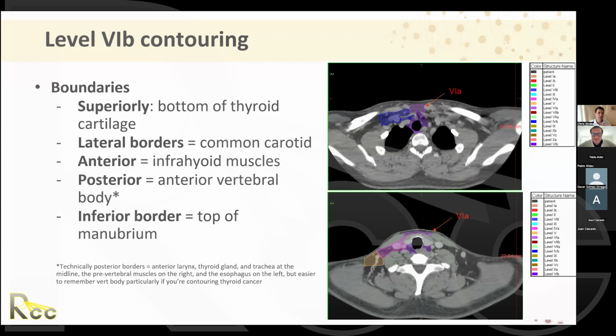There's a muscle called the platysma muscle that is going to be exterior to basically all the vessels, muscles, and organs of the neck, and that's going to be posterior to the fat and skin. And so usually I would stick behind the platysma muscle. That's perfect. So then we take care of the platysma to set that field. Yes. Thank you. Great questions. Any others before I go on?